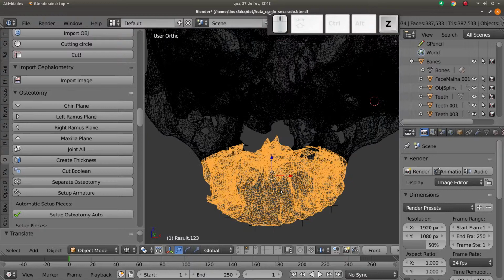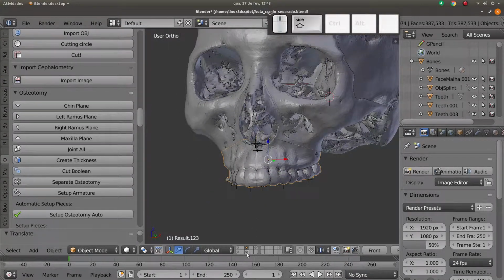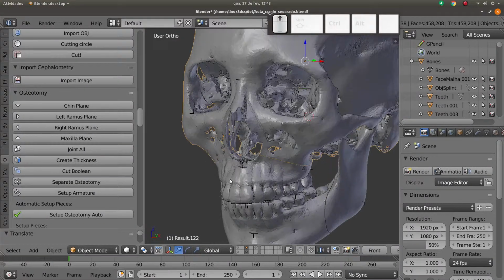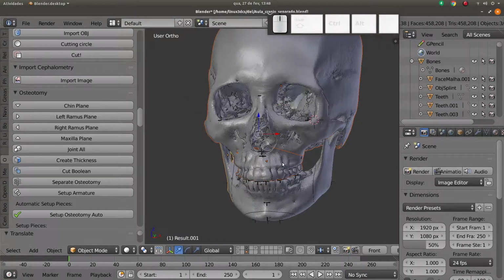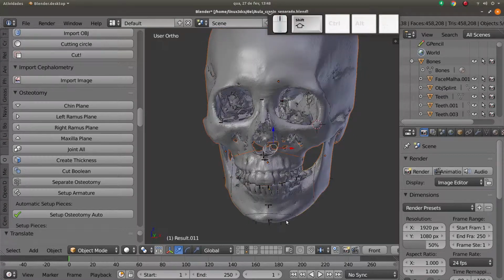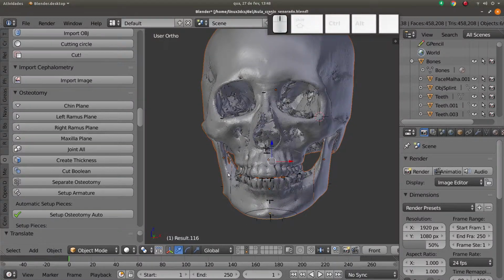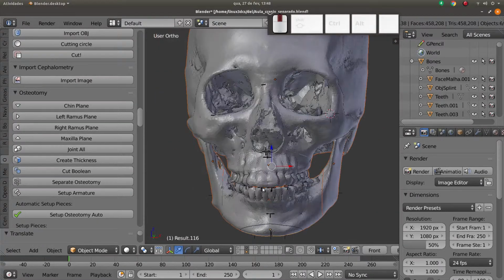So when I select here, this part is separated. Now I select the down part, and I have one. I will select all the objects. This with shift and right mouse button, this and this. Okay, we selected 1 2 3 4 5 6 objects, right?